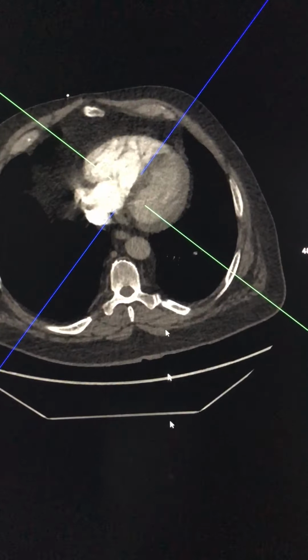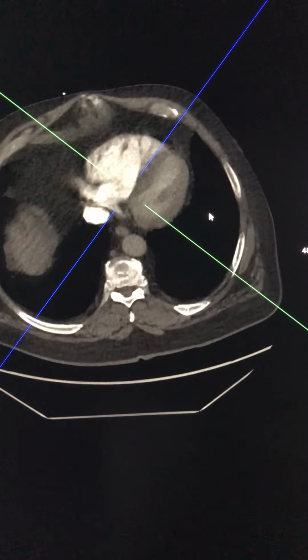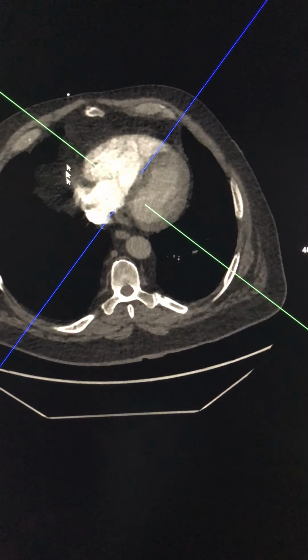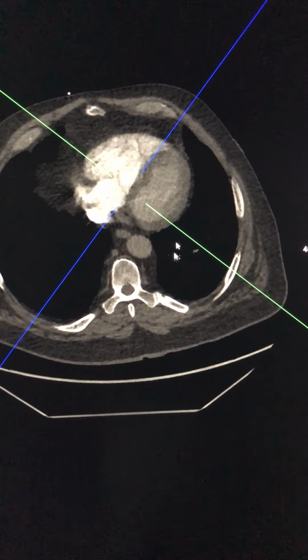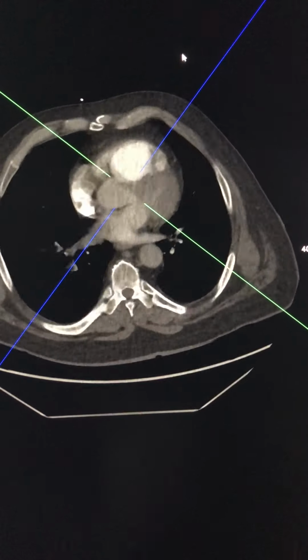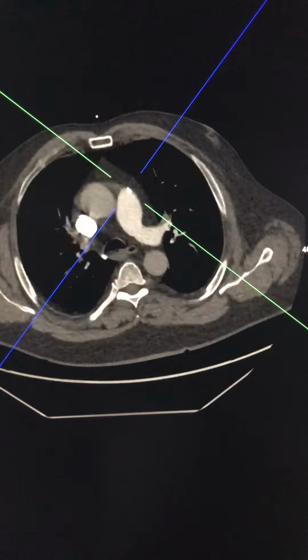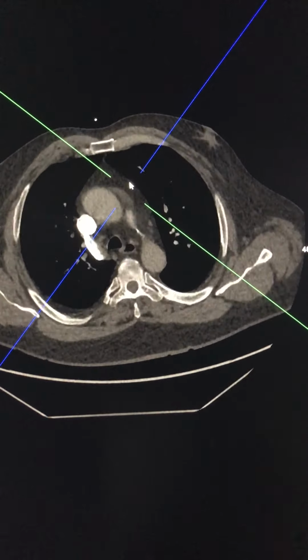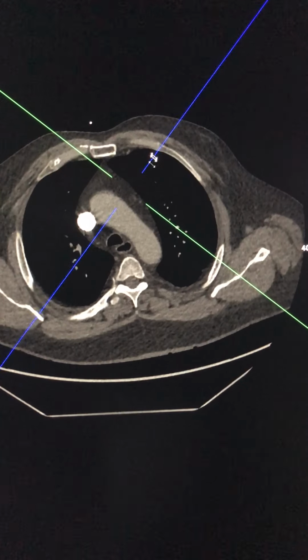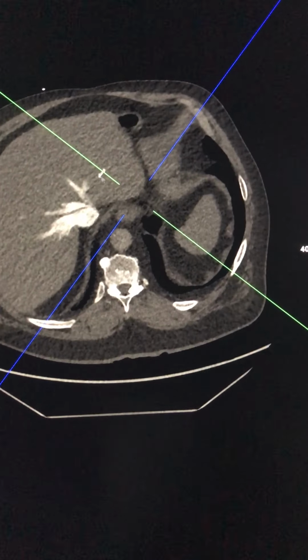The next feature is to look at the overall proportions of the right ventricle and the left ventricle, and in some instances, this paradoxical right-sided cardiac chamber enlargement. A further feature is further backflow effects for contrast, and here we have contrast reflux into the azygous vein and other accessory veins, like in this case, the superior intercostal vein coming through here, and also reflux into the hepatic veins.